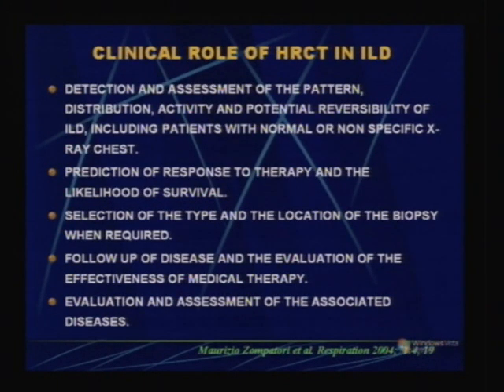So what is the role of HRCT? Now HRCT is far more superior to X-ray chest in the evaluation of interstitial lung diseases, because it gives us much finer details of the gross anatomy of these patients. The changes which were described by Dr. Sain in histopathology can be very nicely delineated in the HRCT.